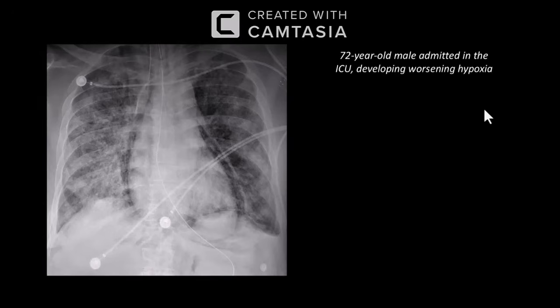This patient requires observation, and as the patient is in an ICU setting, this pneumomediastinum could be due to some line insertion. So the patient should be kept under observation and monitored carefully for this. And if there is any suspicion of esophageal rupture, a contrast-enhanced CT scan can be done to evaluate further for this patient.